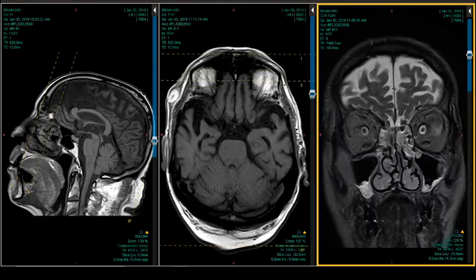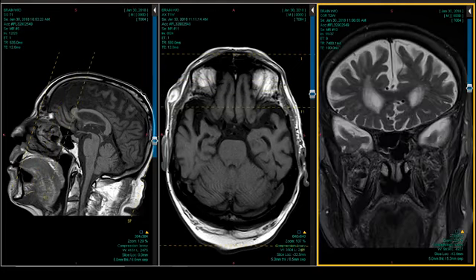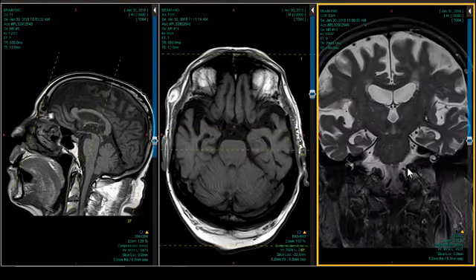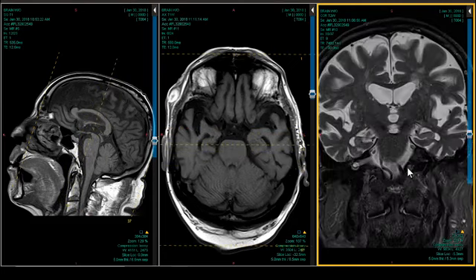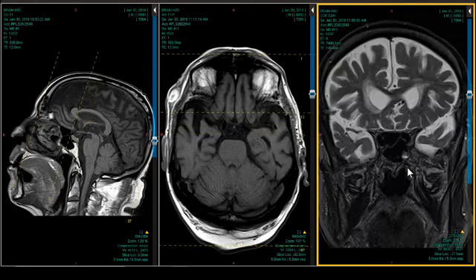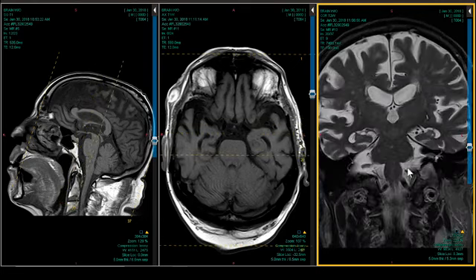Actually, sinus disease is very common in this particular entity for reasons we'll discuss in a few moments. In fact, it's very common in patients with all mid to late stage dementias. It has to do with airflow, swallowing, eustachian tube dysfunction. This patient has it.